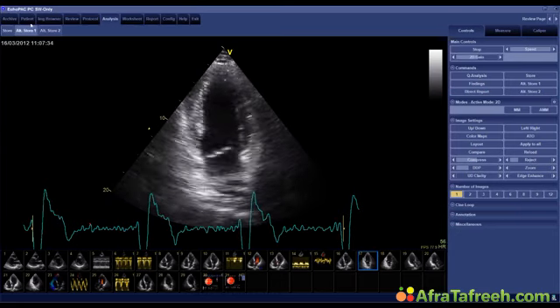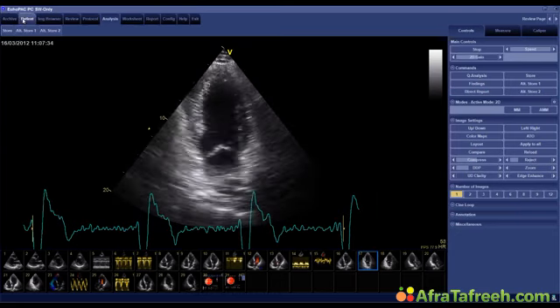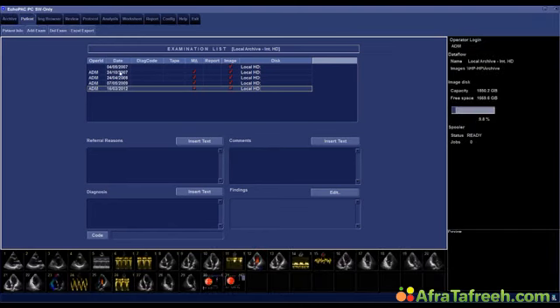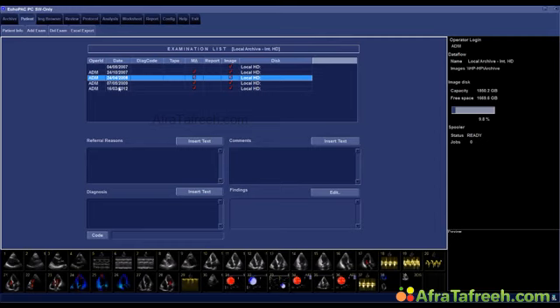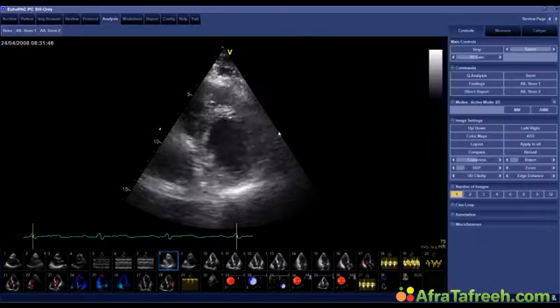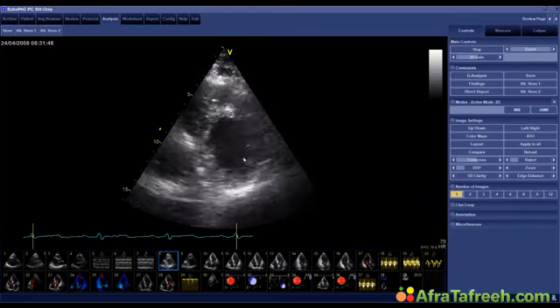And okay, he was off. And we didn't see him until he came back for his yearly exam. And the next thing I'll show you now is the next exam we performed, which was in 2008. Okay, so this is the next study I'm going to show you. And again, I want you to tell me how good left ventricular function is.